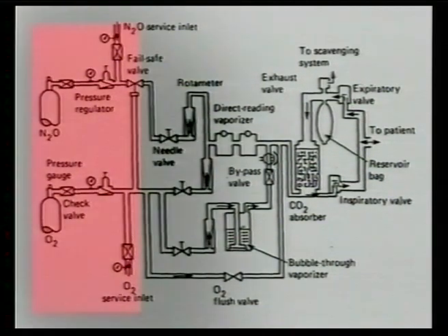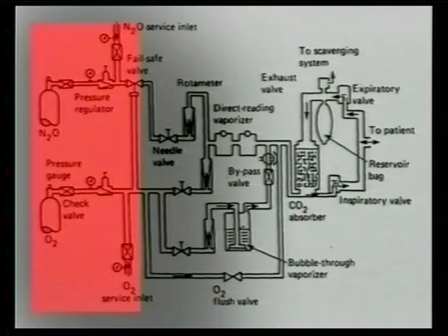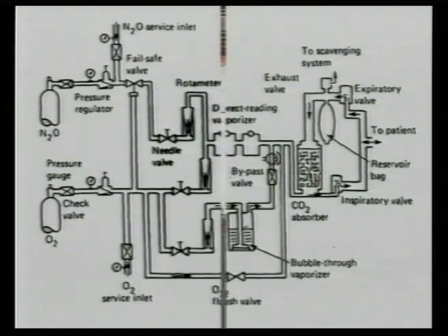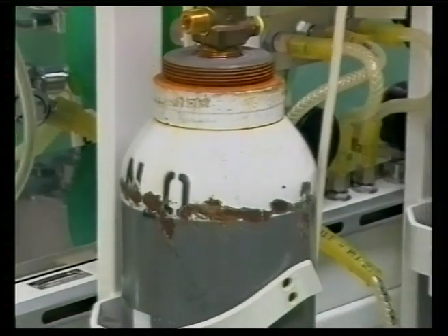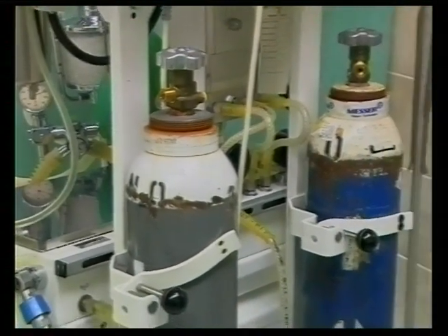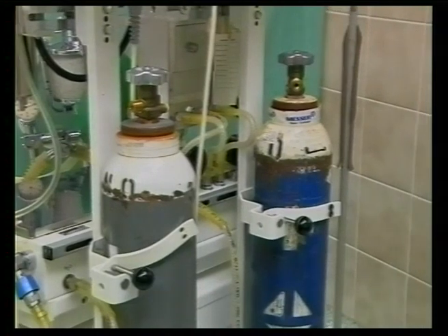Still, the essential part of every anesthetic machine is the source of medical gases. The gases are usually oxygen, nitrous oxide, and air. They are delivered either from cylinders or from external tanks. Their mutual non-exchangeability is ensured by various means. The cylinders are of different colors and of different thread diameters.